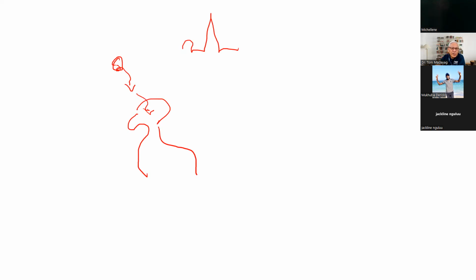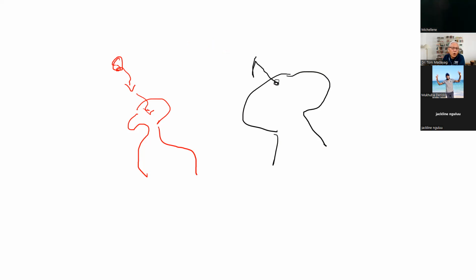However, in the case of a junctional beat, or a beat that comes from the AV node, what usually happens is this. If this is the AV node, the impulses are now going to be generated from here, and thus the impulse will go backwards, resulting in an inverted P wave. Or it could be right in the middle of the AV node, and this will result in a P wave that cannot be visualized, and therefore it leads to the second characteristic of junctional beats.